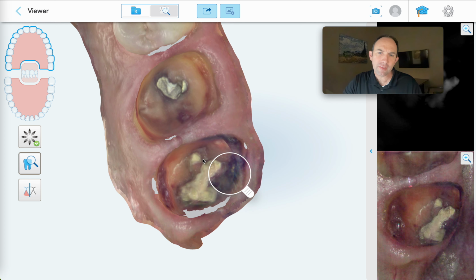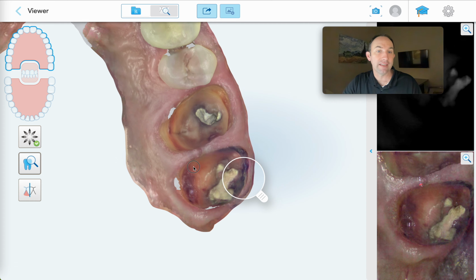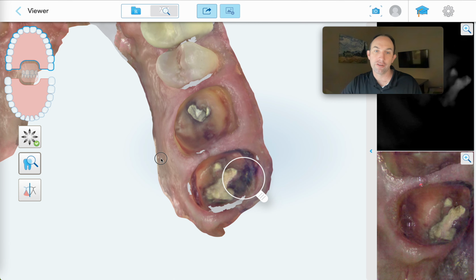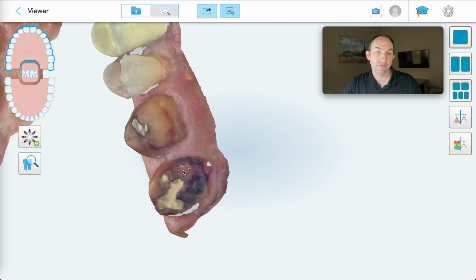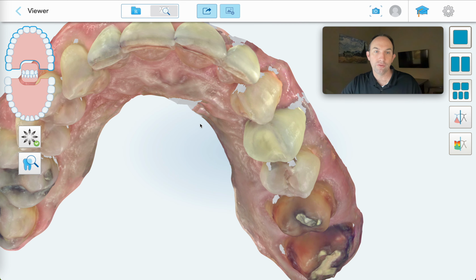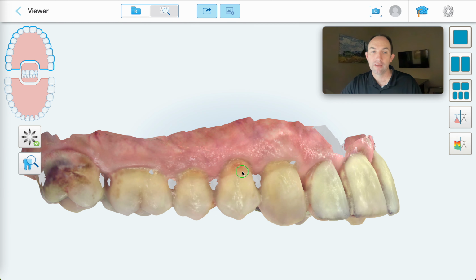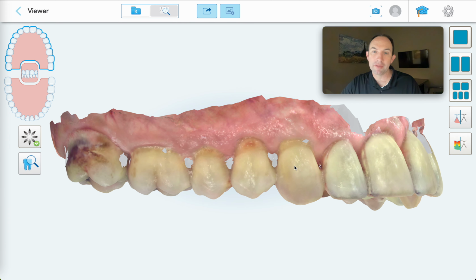So in this situation, we did actually complete 2 crowns on these teeth, and they did not need root canals, either one of them. The long-term outcome, in my opinion, is good. I think both of these teeth, from a long-term standpoint, will be very, very serviceable to this patient. Now, she does have some periodontal disease, and so she'll be undergoing scaling and root planing therapy along with a 3-month accelerated recare to help manage the periodontal maintenance.